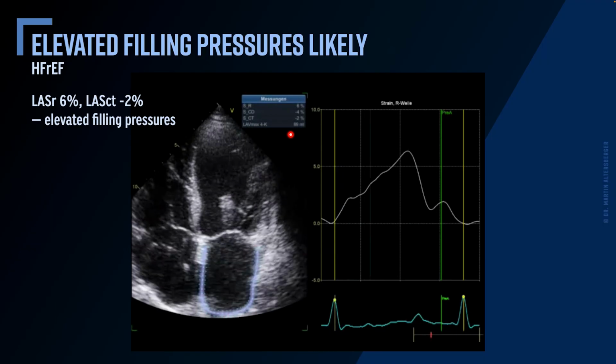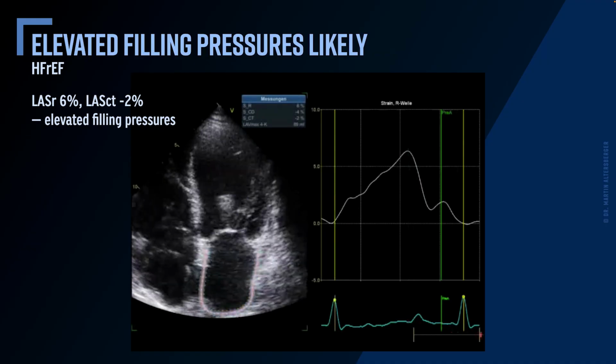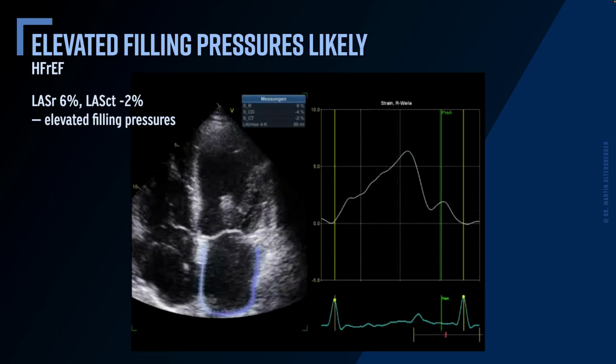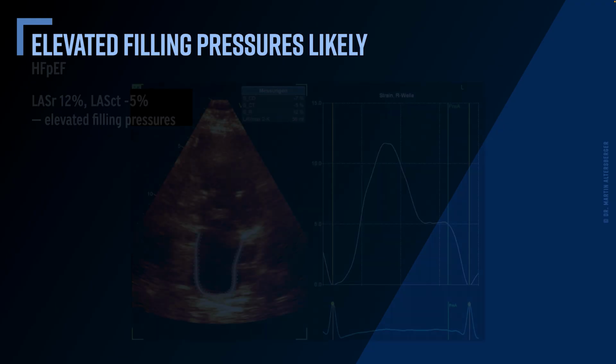Also, the volume is significantly larger compared to the patients before. So this is a significantly reduced left atrial strain, reservoir and contraction. It is pointing towards significant elevation of filling pressures.